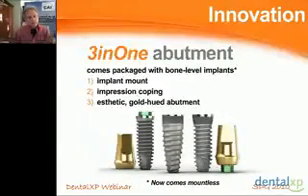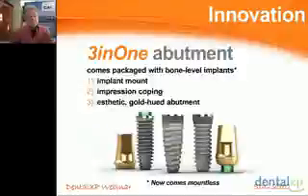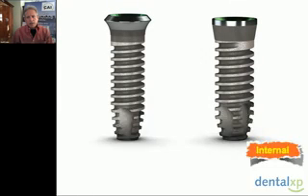So it's tremendous prosthetic flexibility, and if you orient the flat of the hex towards the facial, you'll be able to utilize and expand your use of the stock abutment family offered by BioHorizons or any of the other companies that you may use. And we talked briefly about the laser lock micro channels.